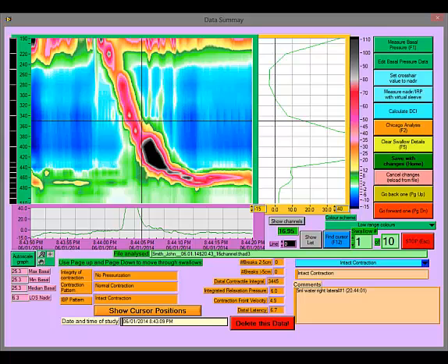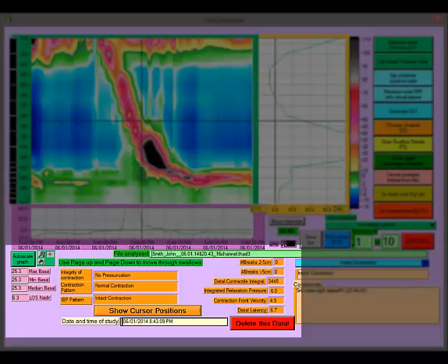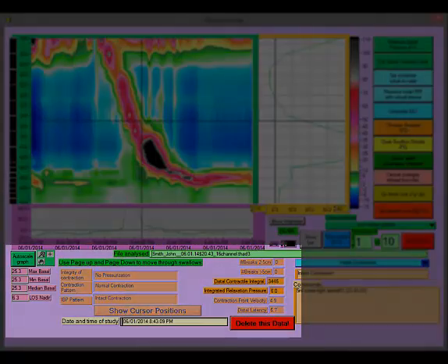The appearance of this screen will depend on whether you have data classified according to the Chicago system or not. If you have analysed the data for this swallow using the Chicago classification screen in the analysis program, the data will be shown as it is here. If you did not, most of the tan coloured indicators that contain the Chicago data will be absent.